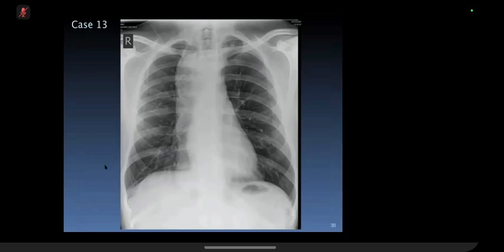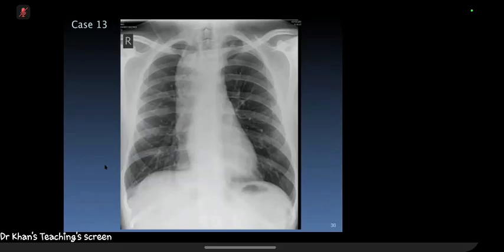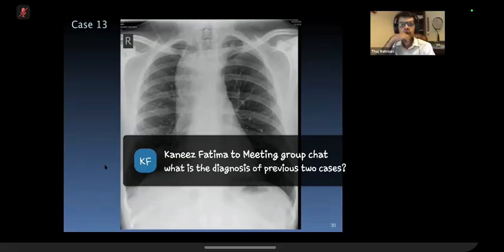So this is a frontal chest radiograph. The superior mediastinum is abnormal. There's increased lucency, with areas of punctate lucencies actually, and increased density and irregular edge on the right side. The appearance is suggestive of previous surgery, possibly a gastric pull-up or colonic interposition. I'd like to look at previous imaging.